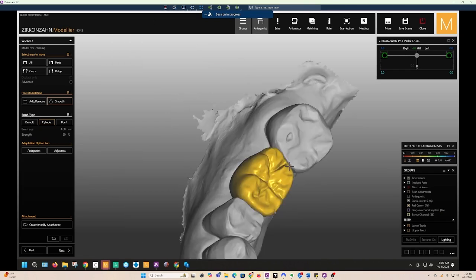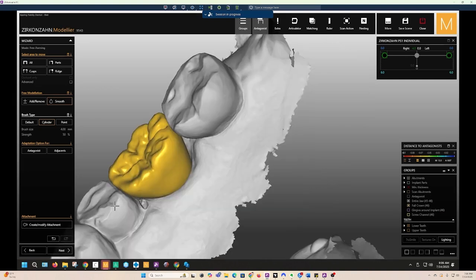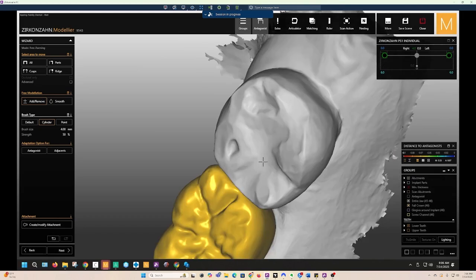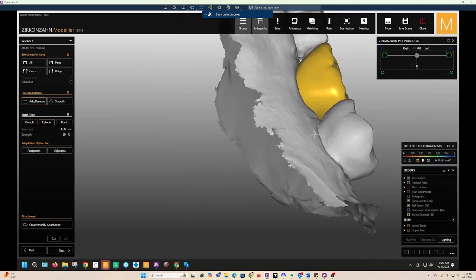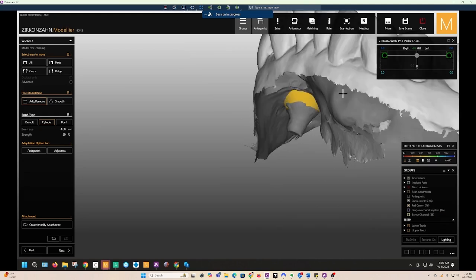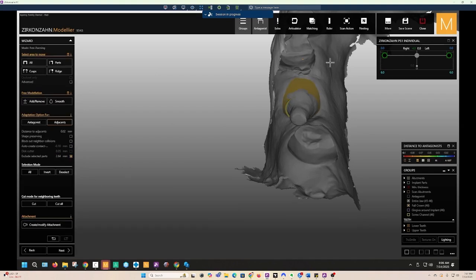Okay. I'll tell you what, I want to just increase this area a little bit. Good. That area is fine. Now, when we increase like that, we have to always do the adjacent adjustment again. If you have a look at it through here, can you see how that's too much? So, adjacents, exclude selected, click on it, invert, and cut. Okay, good.